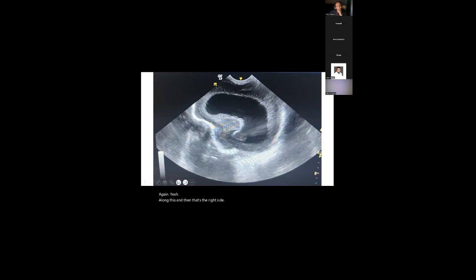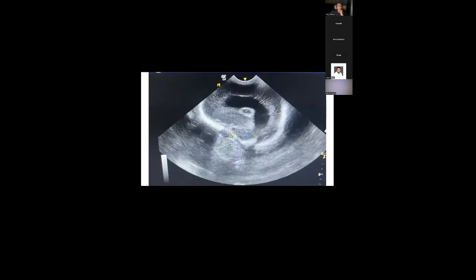So now would we say this is a bit of choroid or this is a bleed? This is a bit of choroid. I can't see clot over there. There is a very bright ventricular margin here, not so bright over here. So whether there's an element of ventriculitis, and then again, what you can see is that area of leukomalacia coming in, which is more in keeping with the periventricular leukomalacia that we'd see. Yep, as far right as you go. So clot again here, correct, which we saw.